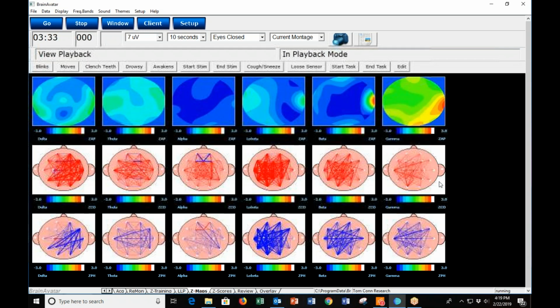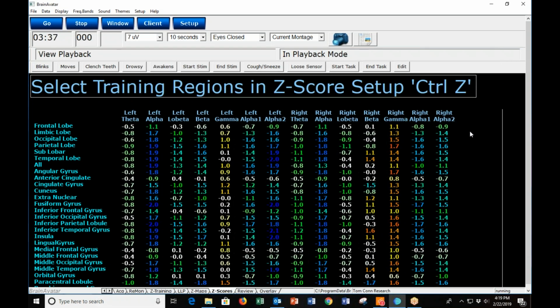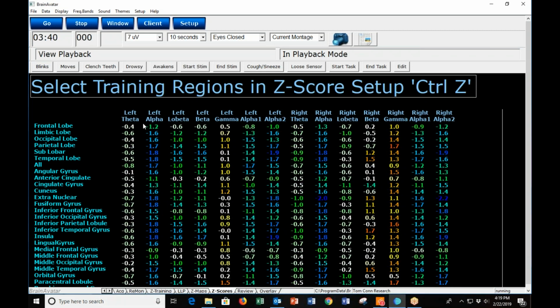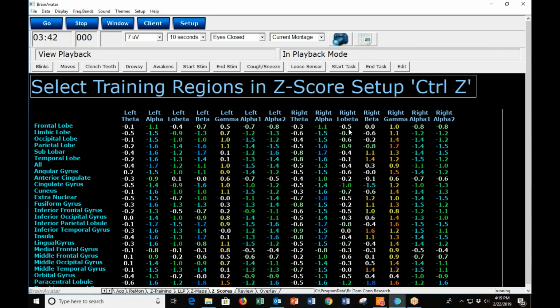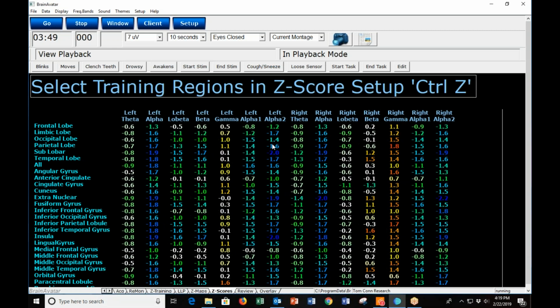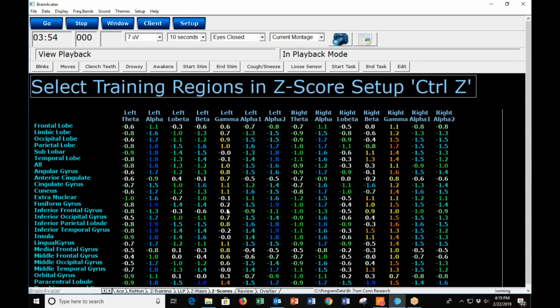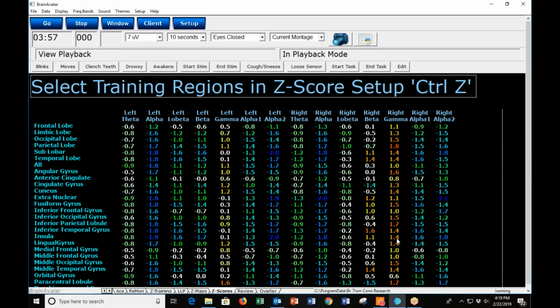And then we see coherences and phase also live. And we can even list Z-scores by region, frontal lobe, occipital, et cetera. We have for all the frequency bands the Z-scores, and there again we see this diffuse alpha deficit, most pronounced parietal, makes a lot of sense. And then the excess of gamma, which interestingly is asymmetric. There's more gamma on the right than on the left. We did notice that there seems to be an asymmetry, more things going on the right.